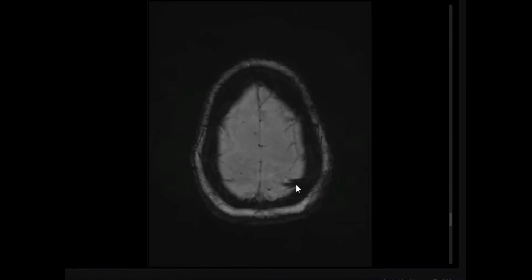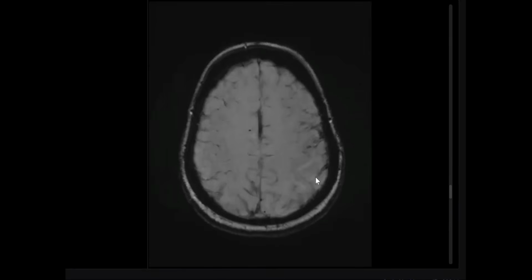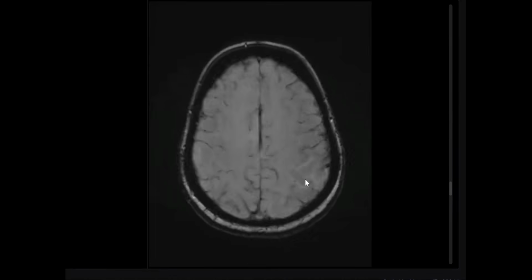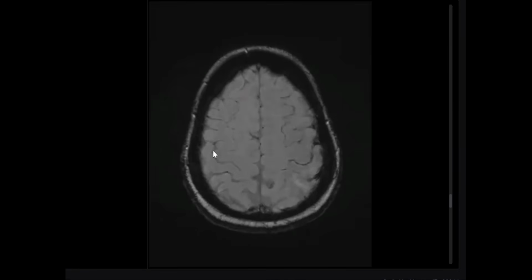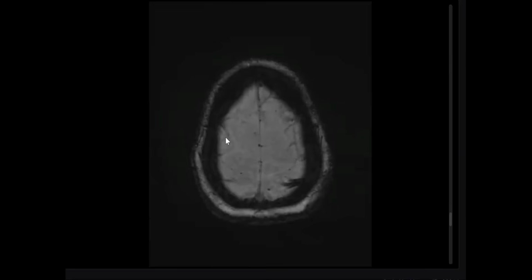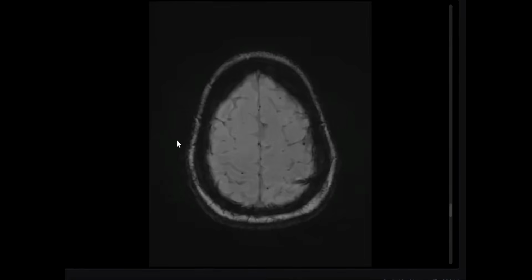This is cortical vein thrombosis, causing the cortical vein to be full itself. But no significant blooming in this area. Very good, my friend. So your diagnosis is cortical vein thrombosis causing left high parietal infarct. Yes, very good. And immediately refer this patient to neurosurgery and advise anticoagulation start.